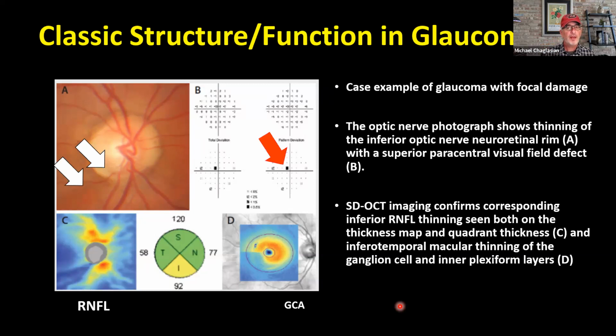Doing a visual field test and looking for small isolated defects that may show up in the central portion of vision that some glaucoma patients present with. It's not all about peripheral or edge defects or nasal steps or arcuate scotomas. Looking at the thickness map for the retinal nerve fiber layer, there's a great example in the lower left for an inferior temporal bundle defect. That dark blue area shows where the thinning to the retinal nerve fiber layer is, and it's in that very classical pattern that we see.